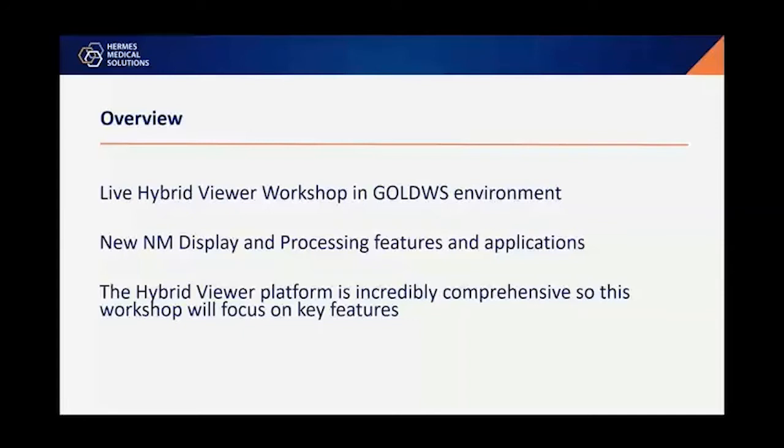So I'm going to be running today as a live Hybrid Viewer workshop, actually running it live on my system on my Gold workstation environment. I'm going to be talking you through some of the new features that we've got coming to existing applications, but also some exciting new applications adding to the nuclear medicine processing suite.